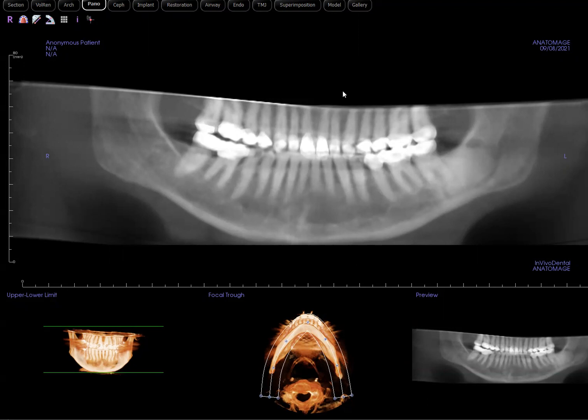Today's case is going to be a recurrent odontogenic keratocyst, a recurrent OKC. And we all know from literature that odontogenic keratocyst has a high prevalence for recurrence. That's why they need to be followed up with radiographs at regular intervals to ensure that early recurrence can be detected and treated accordingly.